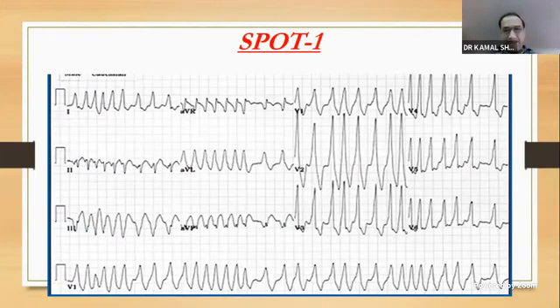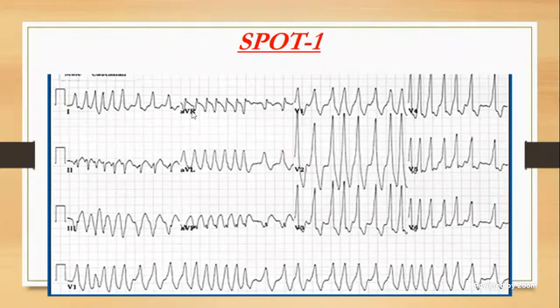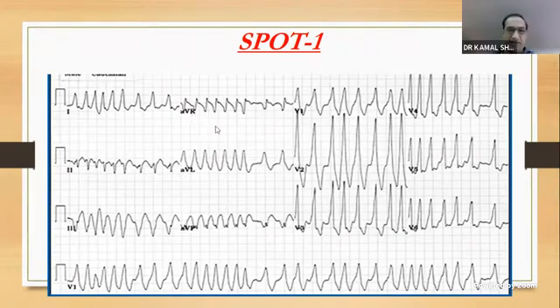So again, a very bad methodology, I would say, Sunil, for a DM level exit exam. Most of my colleagues will agree that at DM, you would not be happy enough to understand just left or right axis. You would be more interested in getting the exact value of the QRS axis. For that, you'll have to go by the equiphasic approach. Correct, Sunil. So can you do the equiphasic approach?